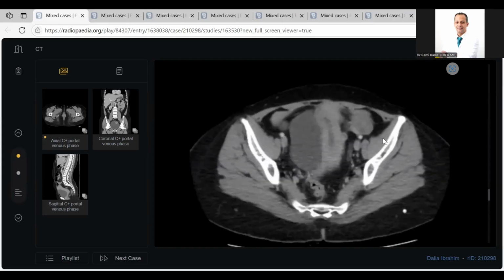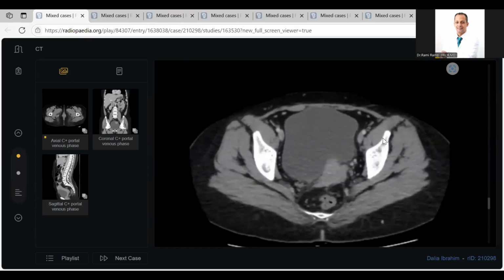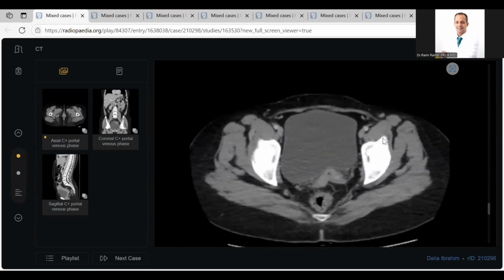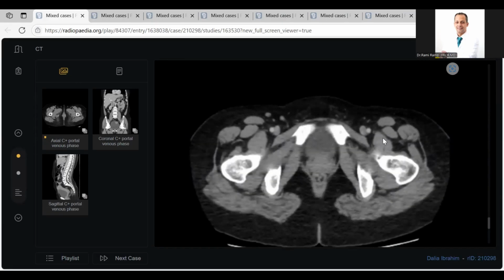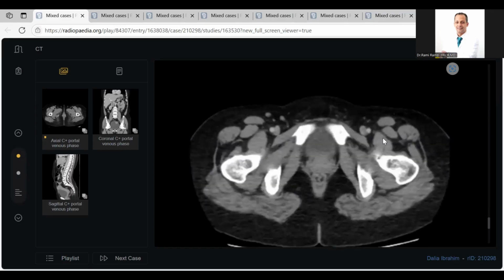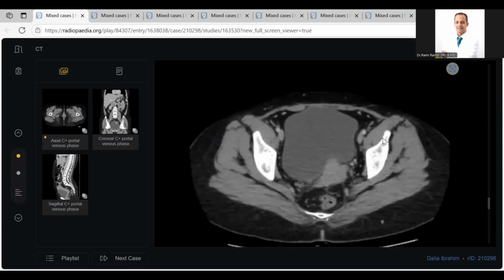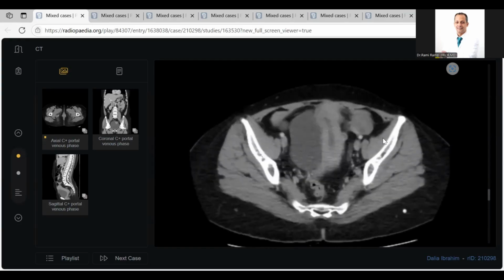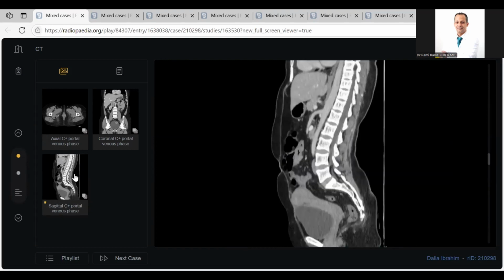Going down further, as there is a history of cesarean section and there is frequent discharge, I am suspecting, most probably, vesicouterine fistula. I'm thinking along that line. However, I'm not able to delineate any fistulous communication, but I would like to see a sagittal view, if I can.